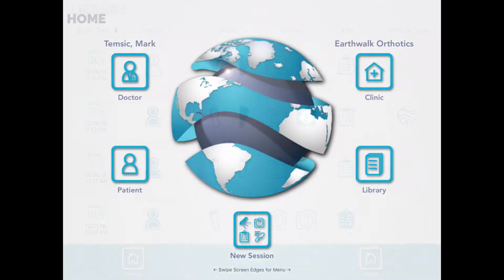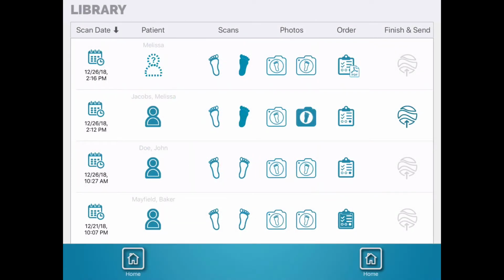And then when you go back to the library view, you'll see the top patient is Melissa. She doesn't have any patient information filled out for her, that's why there's a question mark, and we only completed a scan of the right foot. That's why the right foot's blue. So what we can do now is click on Melissa.